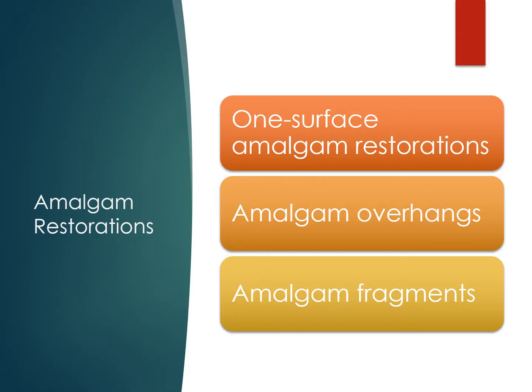So we're going to get into amalgam specifically because amalgam is one of the most common restorations that have been used in dentistry. It's not the number one most commonly placed filling today. We've sort of shifted away from it a little bit because of the metal that when patients open their mouth, they don't like the way that metal looks.